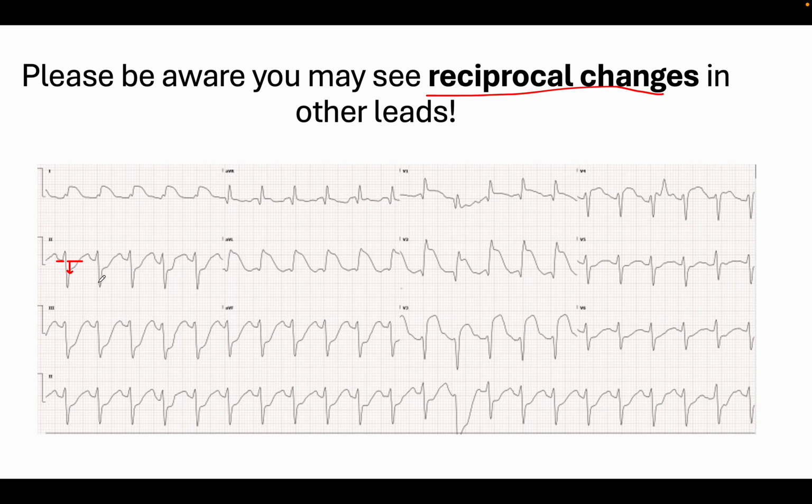So we would just call that reciprocal changes. So if you were to summarize this ECG, you would say sinus tachycardia with an anterolateral STEMI with reciprocal changes in the inferior leads.